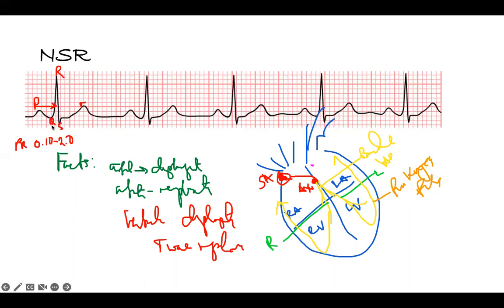And then the QRS, the distance from Q to here, has to be less than 0.12 seconds.